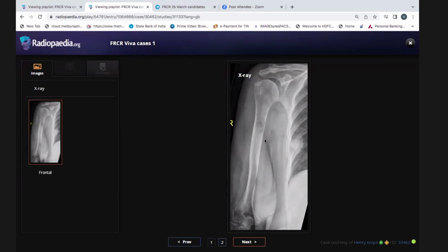I think if you put the clinical scenario in the picture rightly, you will be able to come to the diagnosis properly. You picked up this finding very well. Even if you had said this was a metastasis and then looked at the arm, since it was arm pain, there would be a metastasis over there. This was the primary, and this was the metastasis.